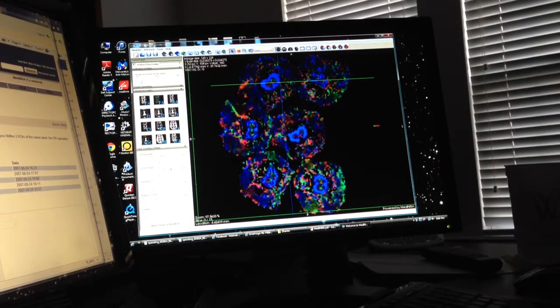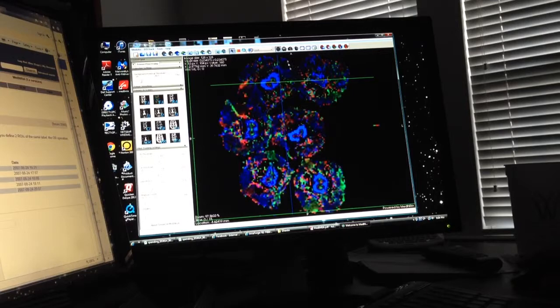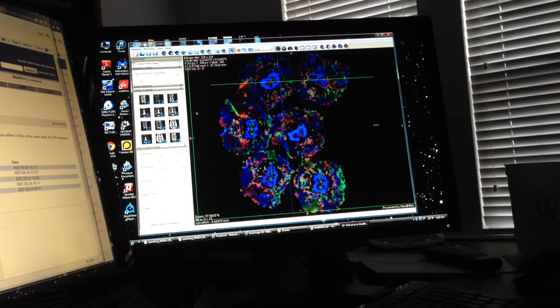Okay, so what I have here is the coronal image that I got by selecting here. I've already computed the FA image, color FA image. I set the background here to 99 just to remove the background. And so FA image, so that's that there.